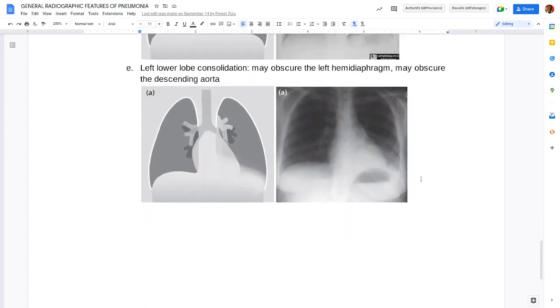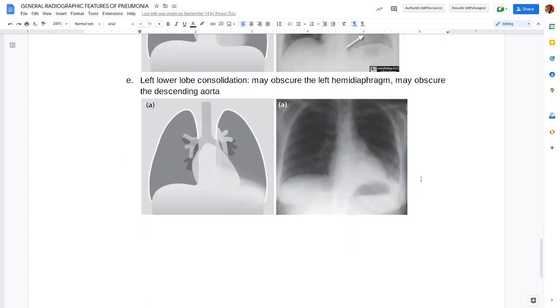So those are the main characteristic features of what pneumonia does to a chest radiograph or chest X-ray. I have a question. What you're showcasing here is classic pneumonia, right? What about hospital-acquired pneumonia? How would you distinguish it from what we're seeing here? What sort of characteristics?